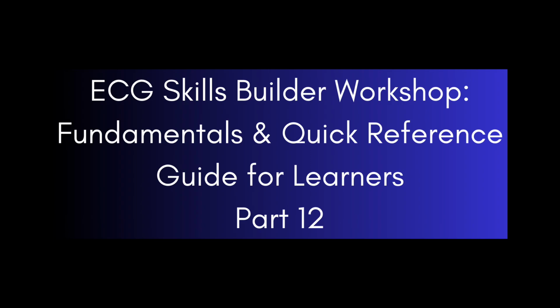Today we will be tying together everything we have covered so far and take a look at how to calculate a heart rate from an ECG and how to examine a heart axis from an ECG. Without any further delay, let's go ahead and get started on today's content.